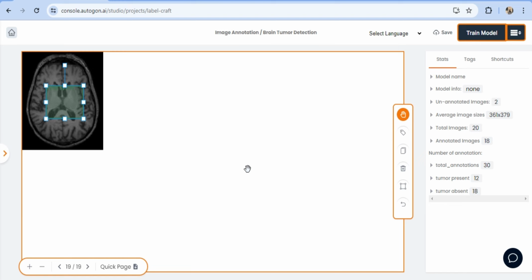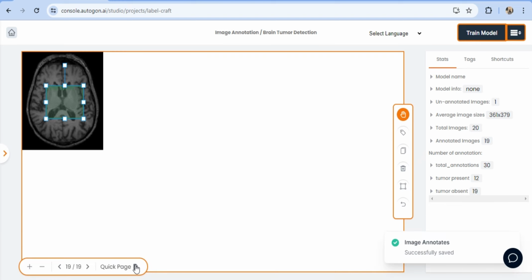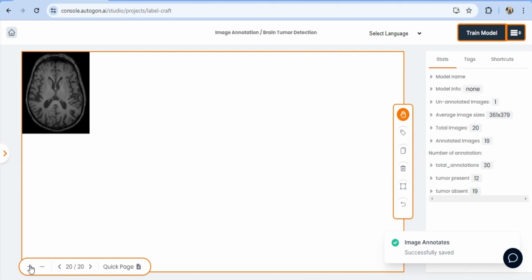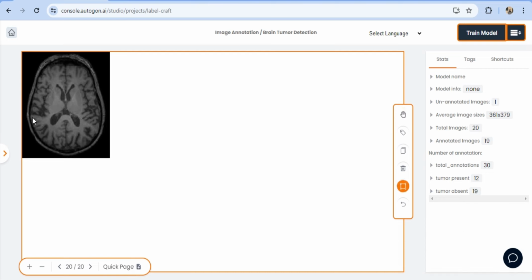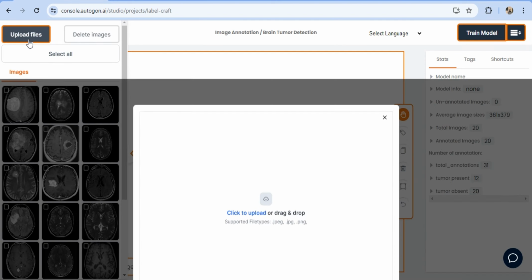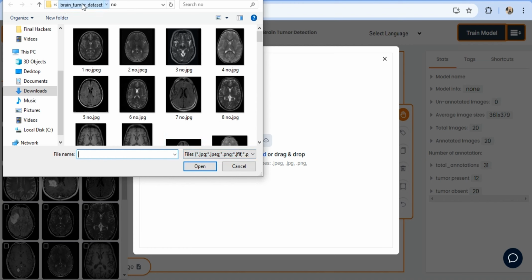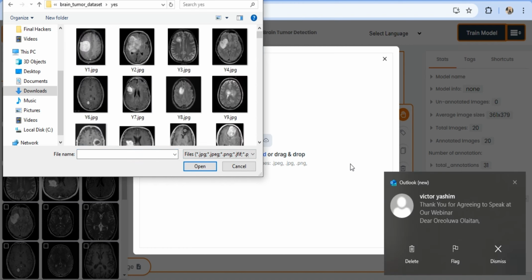Yeah, tumor absent. This is really nice. Let's keep saving it. And I think on the last image, I imported about 20. Let's just see this guy. Okay, tumor absent. This is nice. Okay, so 20 to 12. No, I need to make tumor present up to that level as well. So that's just going to take tumor images from the tumor present part of my data set.